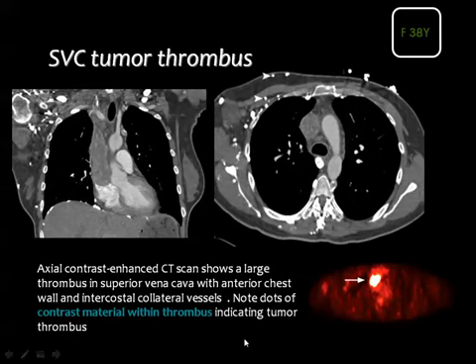And this is based on a thrombus, which would be tumor thrombus by many imaging characteristics. The tumor thrombus will expand the vein, the tumor thrombus will enhance with contrast material, the tumor thrombus will show metabolic activity in cases of PET, and it may be able to extend outside the vein, invading the adjacent structures. All these are differences between the malignant and the regular thrombus.